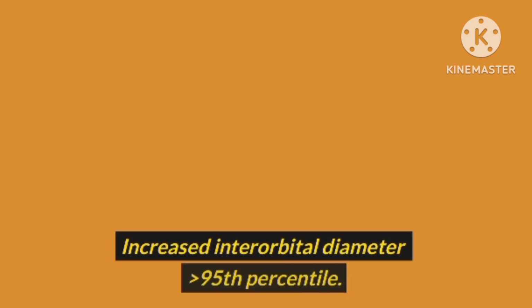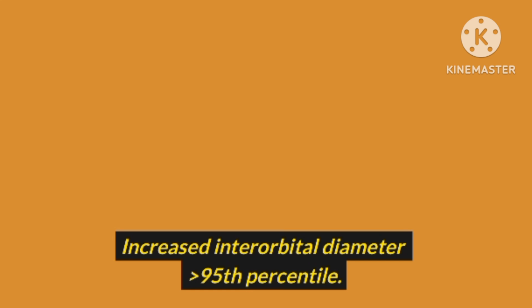Number 6, hypertelorism. Ultrasound diagnosis: increased interorbital diameter greater than the 95th percentile.